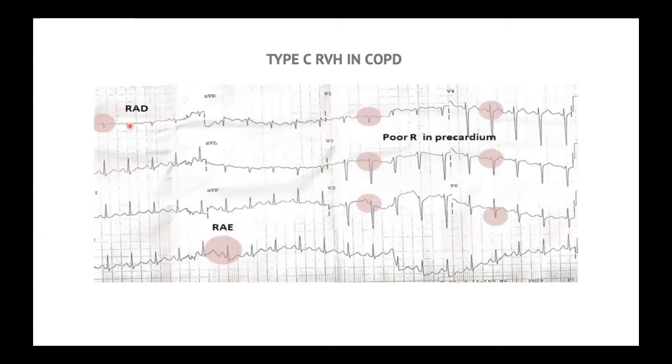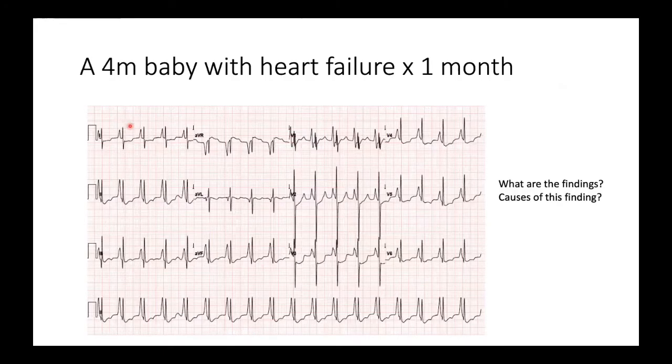So that is known as lead one sign. So this is one of the important features of patients with COPD. Now again, let's discuss one more ECG.